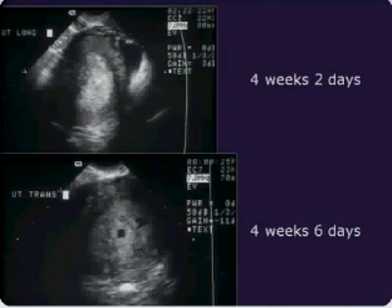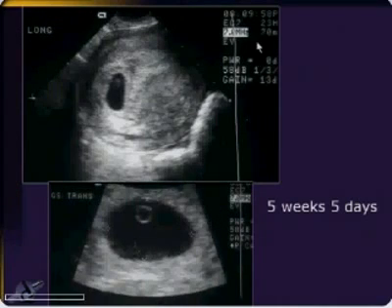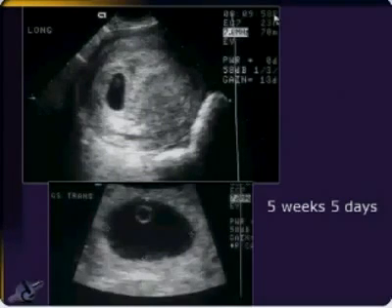But so she goes home and shows up again a week later. Obviously, 8 p.m. was a convenient time because that's when she's in. And resident 3 now scans her. And now we're 5 weeks, and right on cue, now we have this beautiful yolk sac. You gotta love the yolk sac. That tells you for sure this is an intrauterine pregnancy. And so we're feeling pretty good.